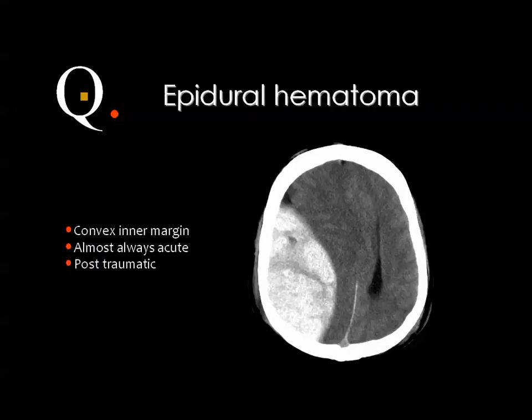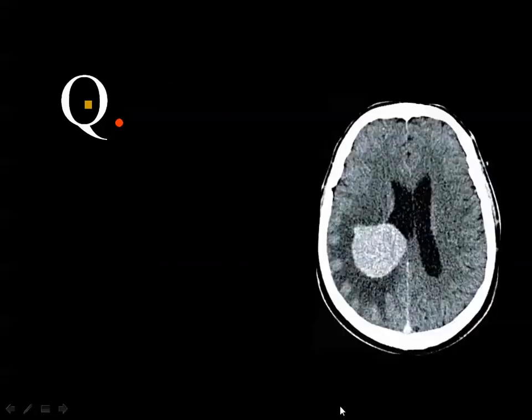And this is epidural hematoma. And we also said something about this relative hypodensity within the hematoma itself. And how can you explain this? Yes, so this is hyperacute blood, and this sign is known as a swirl sign. Whenever you see blood which looks like water, I mean hypodense, intermingled with the blood in the hematoma, then you know that this is acute, hyperacute blood. This is epidural hematoma.